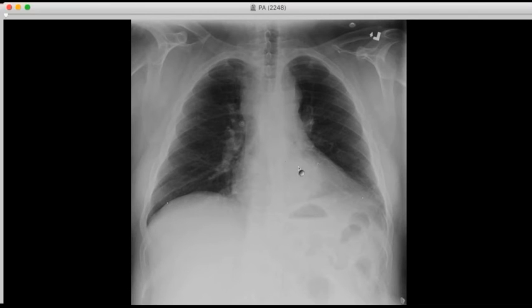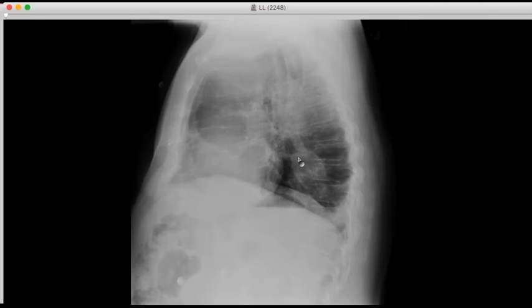You see some of the descending aorta, but this sharp thing. On the lateral, you can see this mass well circumscribed here. It's lifted off the diaphragm. It's not associated with the stomach. So it looks like a true mass. And you don't see much hilar lymphadenopathy. So there was concern there's a lung cancer or some other malignancy.